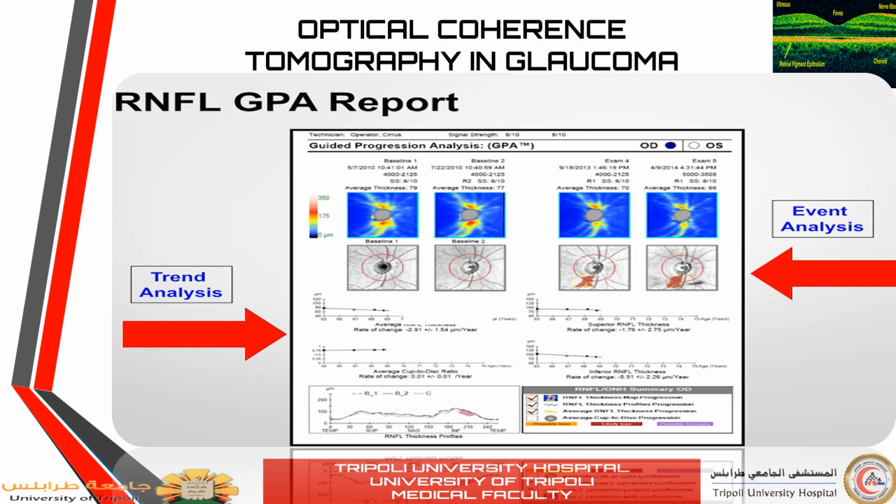And the aim of all of this is to determine whether your patient is stable with your medical treatment or has any progression. And as I said, this analysis is still under the pre-perimetric stage of glaucoma, the stage before the glaucoma appears.